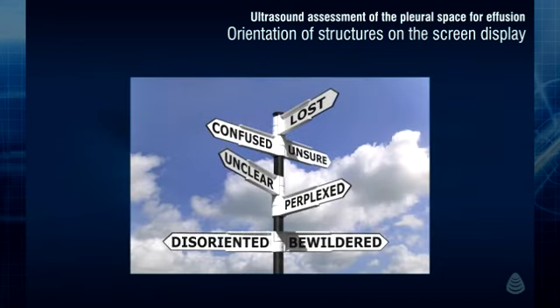Thus, you can see that there is a potential for confusion in relationship to orientation when physicians from different backgrounds work together and share the same ultrasound machine.